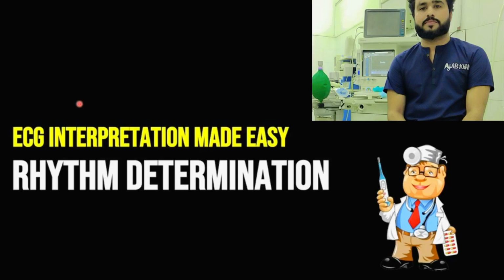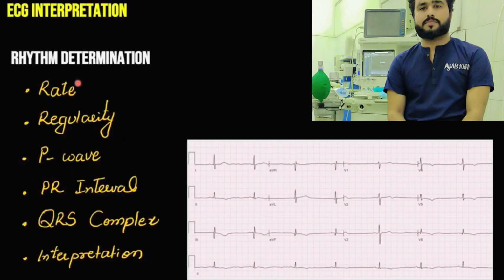Okay, in our video series of ECG interpretation made easy, in this video we are going to talk about rhythm determination. Basically, there are a few things that you need to do in rhythm determination. You have to calculate the rate, whether there is tachycardia, whether there is bradycardia. You have to look at the regularity, whether the rhythm is regular or irregular. You have to look at the P wave, whether P wave is present, absent, and if it is present, whether it is normal or not.